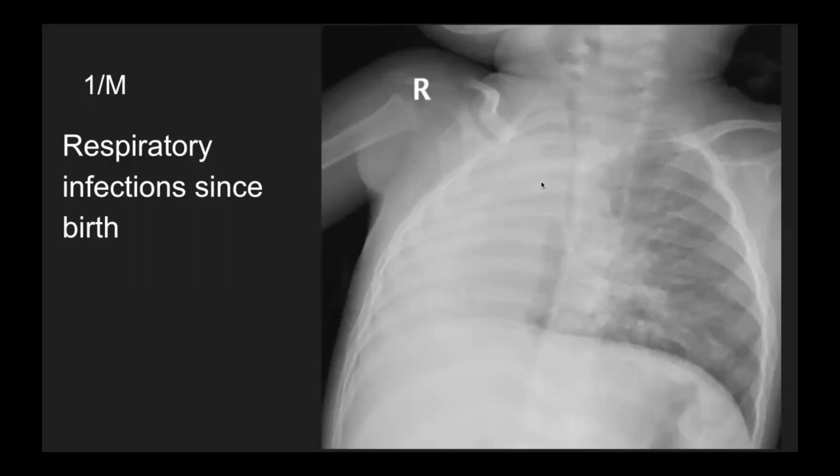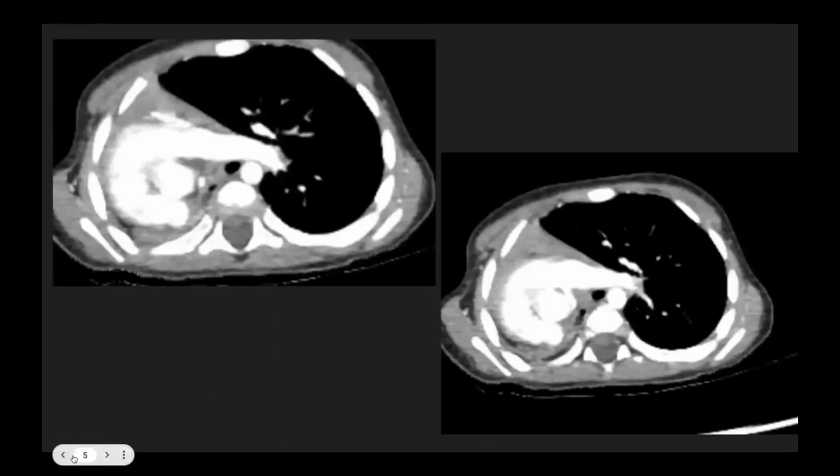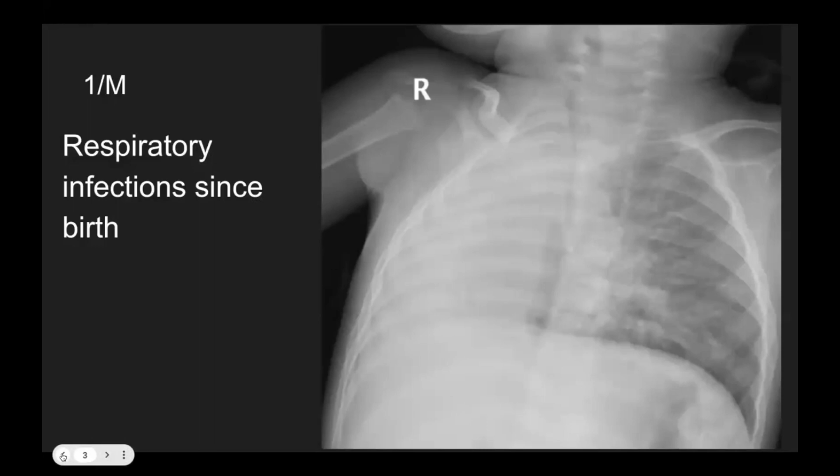Okay, so foreign body. Foreign body is a very good thought. So foreign body is definitely one good thought. Now, if we go back to the previous image, why is it not foreign body? I'll come back to the point later on as well.